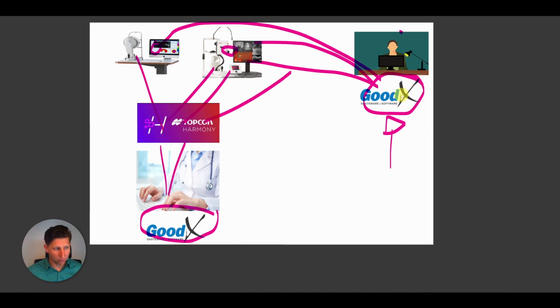Once the patient's data is captured here, it gets pushed to all the machines. At the machines is work lists where you can just click on the patient's name, do the scan, and then from there those scans get pushed to Harmony, and Goodx and Harmony is integrated, so you're able then to view all your scans in one place.